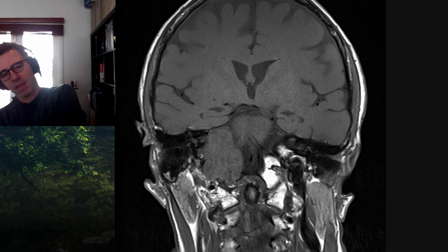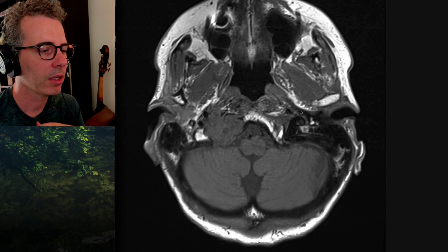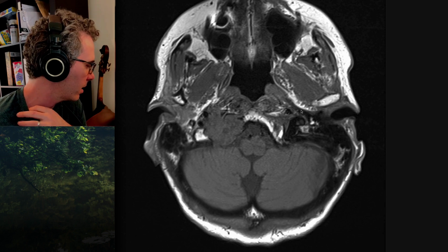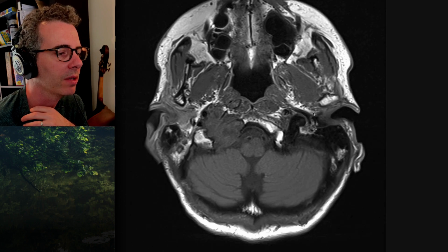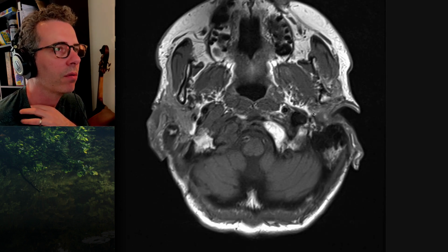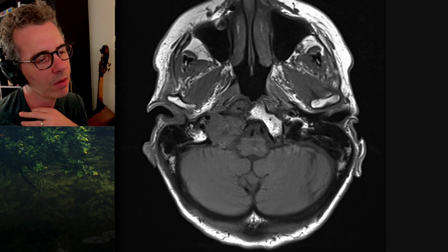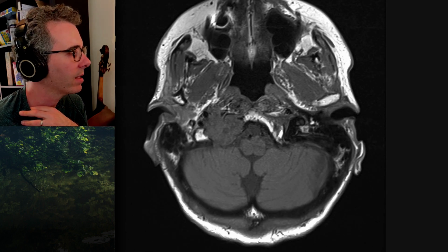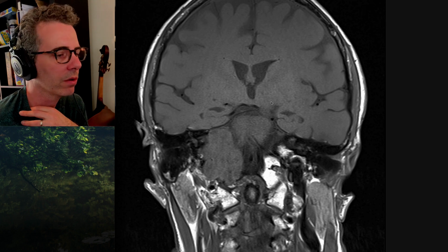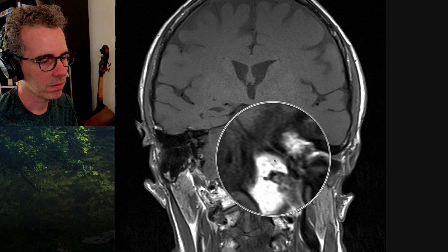Now, finding the hypoglossal canal on MR or CT should be easy. But because there are venous emissaries through the base of skull, and there's the pars nervosa of the jugular with the inferior petrosal sinus going into it, sometimes you can get caught out. And there's one landmark that's very, very useful on coronal, and it's this appearance, the eagle sign.